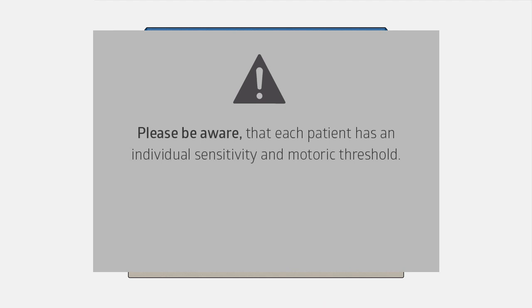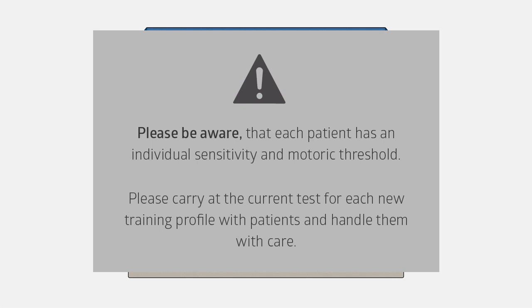Please be aware that each patient has an individual sensitivity and motoric threshold. Please carry out the current test for each new training profile with patients and handle them with care.